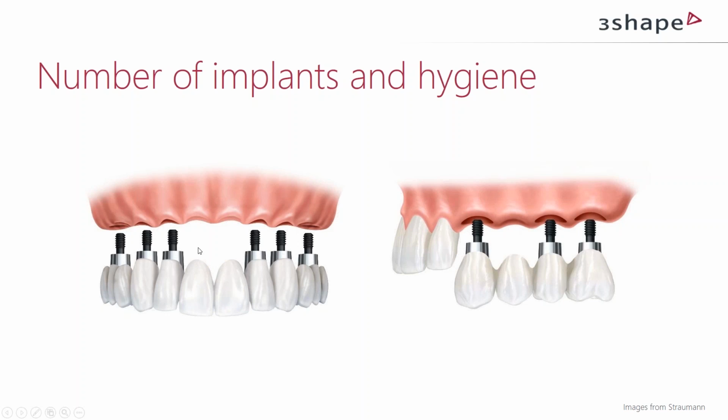This is the most difficult area for implant or bridge users, because here you make the sounds when you talk and when you eat. There can be saliva seeping through, so you actually spit when you're talking and eating. If you can leave this area free from implants, from interference, and let the two pontics touch the gingiva perfectly, then you give the patient a nice confident smile. There are no problems with speech and with eating as well. So this is a very nice technique to give this area better care.